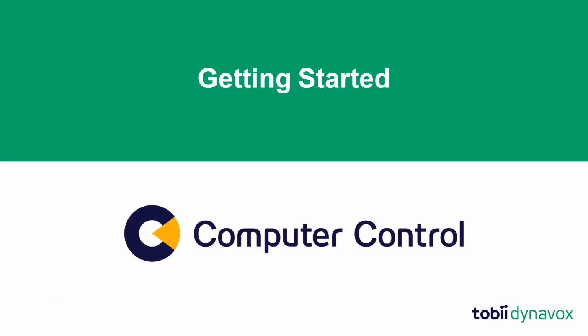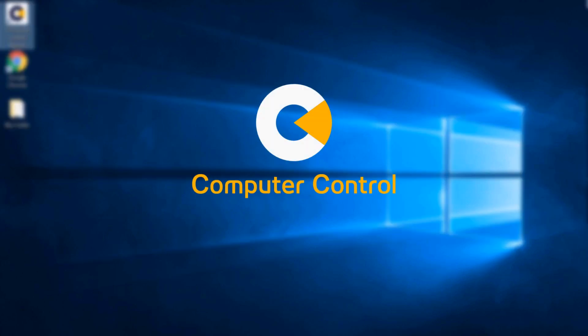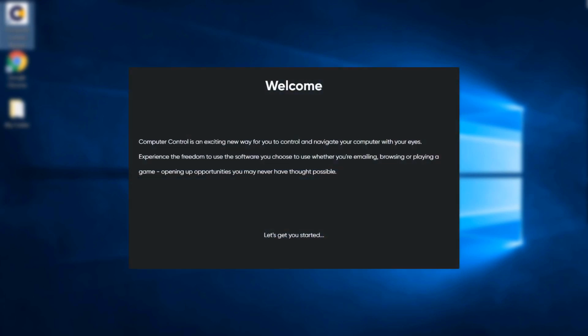Now you've seen what computer control can do, how it makes access easier for our eye gaze users, and the technology requirements to use it. So let me show you how you can get started so you too can explore computer control. So let's get started by launching computer control. Once you launch the program, only eye control is needed from that point on. First, you'll see the welcome screen, which will close on its own.